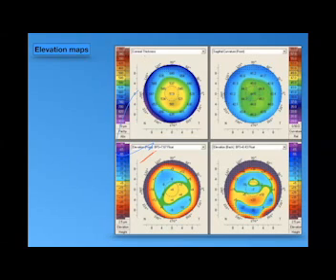Beyond 15, you may suspect there is abnormality. Beyond 21, beyond +21, it's highly suspicious, and you have to suspect this patient and think in refractive surgery again. Especially if you found that the high anterior elevation point is similar to the high posterior elevation in that patient. This is a protrusion. It is a whole protrusion of the cornea, posterior surface or the anterior surface.